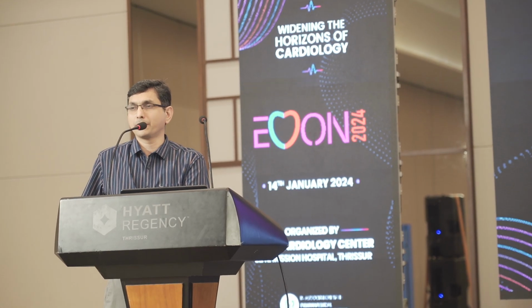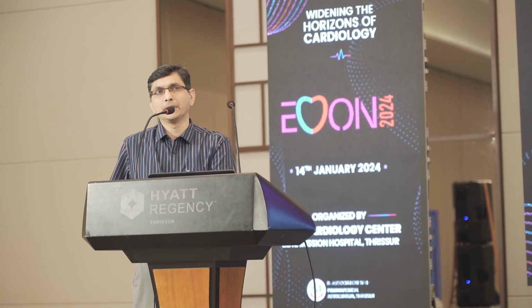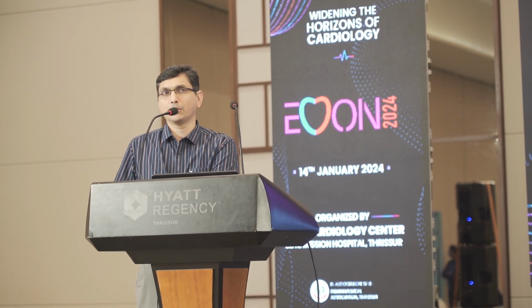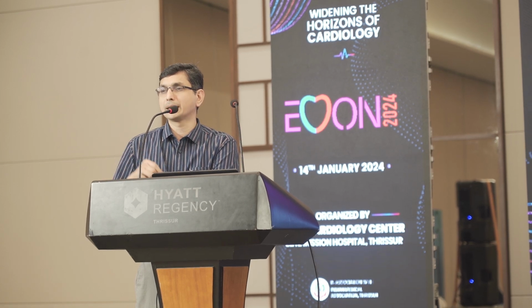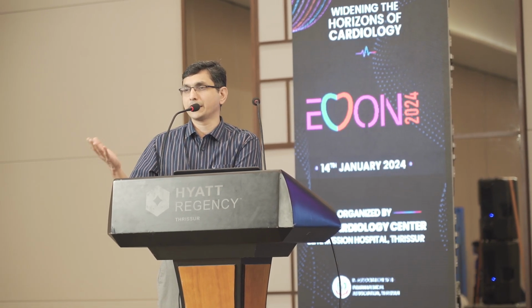Yes, especially in hypertrophic cardiomyopathy patients, if there is an event, then it becomes a secondary prevention. If there is not an event, for the correct thickness assessment, sometimes by echocardiogram, the apical region and anterolateral region may not be that accessible by echo imaging.